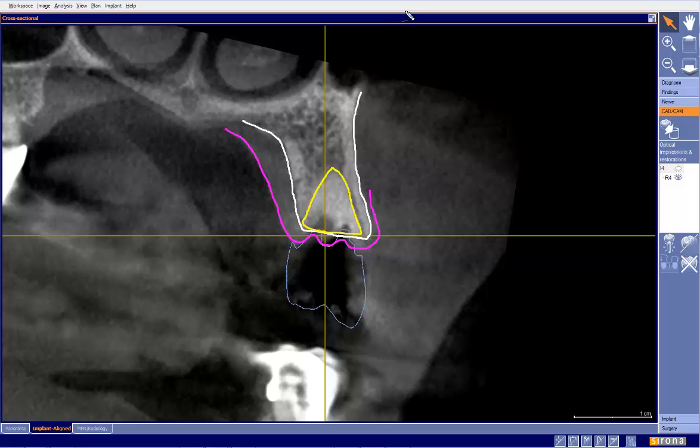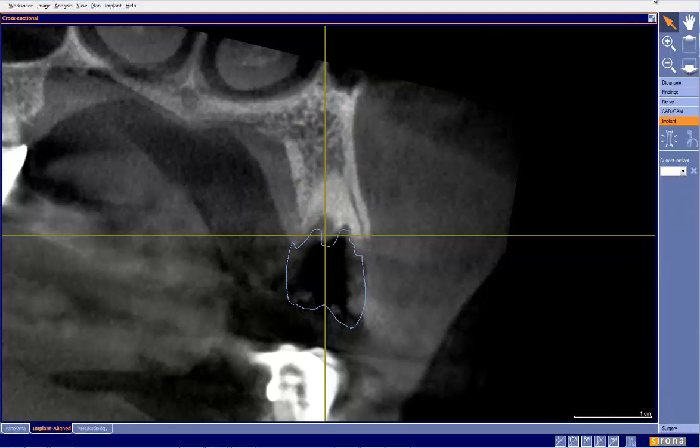So now once I have all of this outlined as I do here, what I like to do now is go ahead and look. So I'm going to use hash lines in green here to show you all this wonderful area that I had for engagement. And then again, we can see the sinuses way up here. So we got plenty of good bone here. The most difficult part of this will be getting the ideal plan and then being able to take the tooth out atraumatically using periotomes, proximators, and apical retention forceps. Should be no issue with that. So hopefully that helps in understanding what we're looking at there.